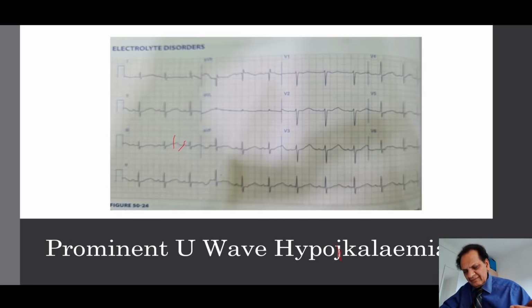ventricular tachycardia. And long QT is accompanied by what? Torsade de Pointes, very important diagnosis. Always keep that in mind.